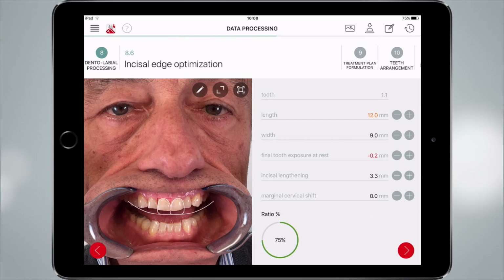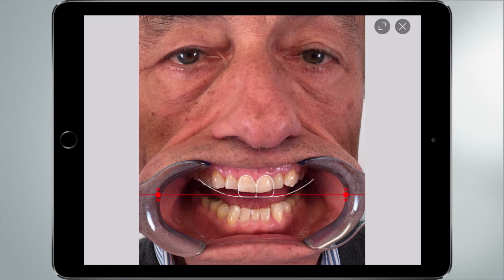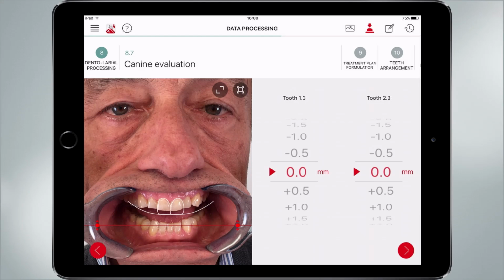Closing. Now, keeping this kind of measurement here, we want to go ahead and see how much I can add here. So we see that the cuspid on this area is shorter than the other one. We can say the level of the cuspid can be augmented.